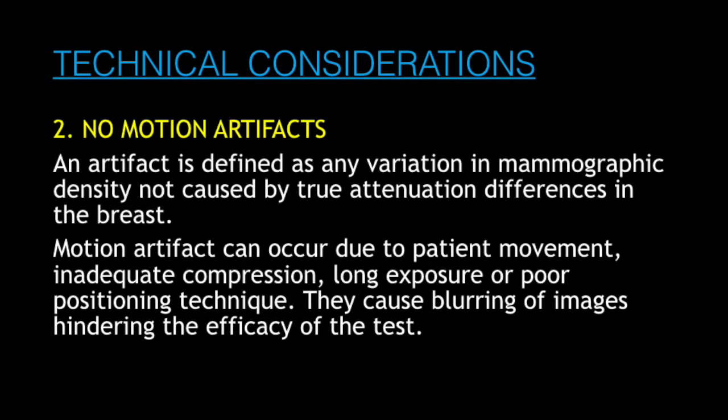It should be kept in mind that excessive compression may lead to discomfort and pain, causing a decline in participation of women in screening programs. There are no quantitative guidelines available to decide the compression force to be applied for acquisition of an adequate mammogram. It varies widely among radiographers, screening centers, and countries. We should ensure that there are no motion artifacts on the film.